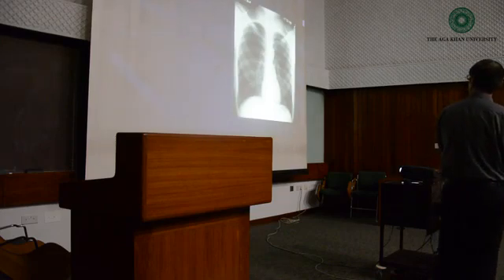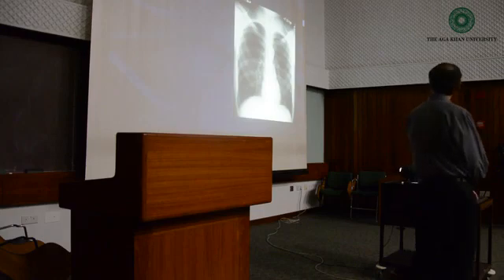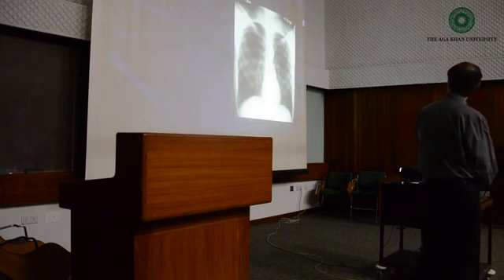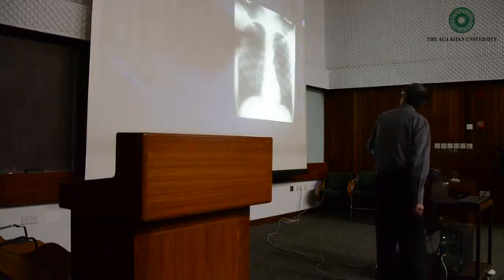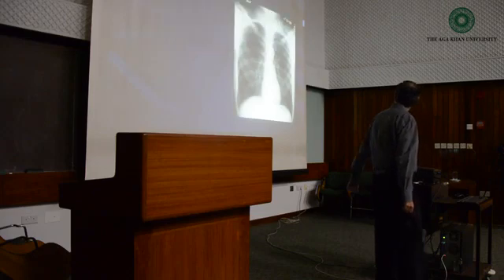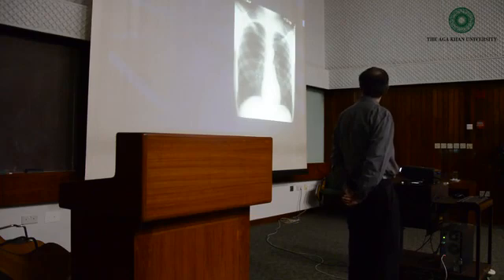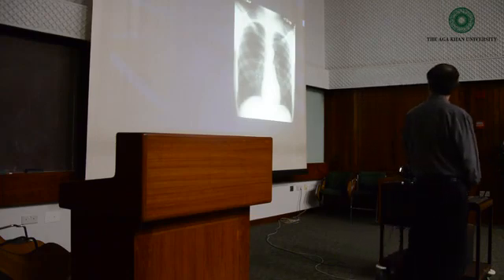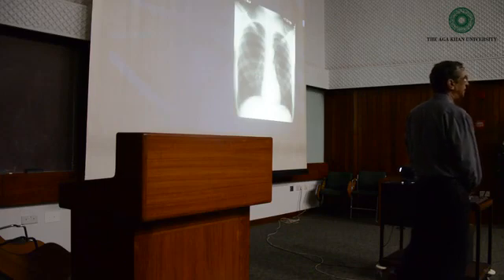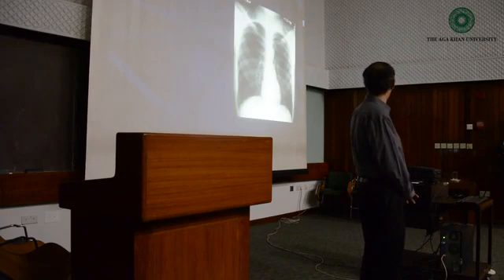Can you see the heart and the chest wall? That is soft tissue. And there is a fourth density, which is fat. There could be a little bit of fat here. Can you see it's a bit grayish? Fat is not very dense. Fat also appears like air on the negative side, but it is rather grayish, not very black, because it does attenuate the X-ray beam to some extent.